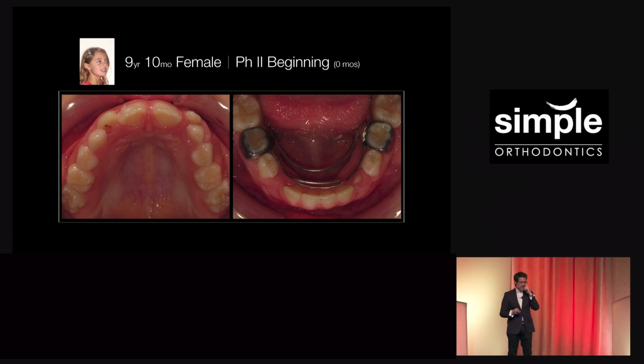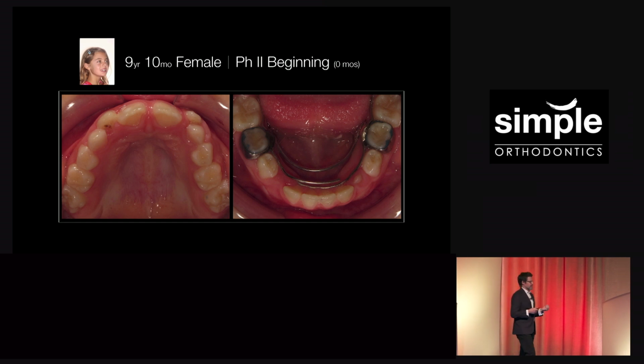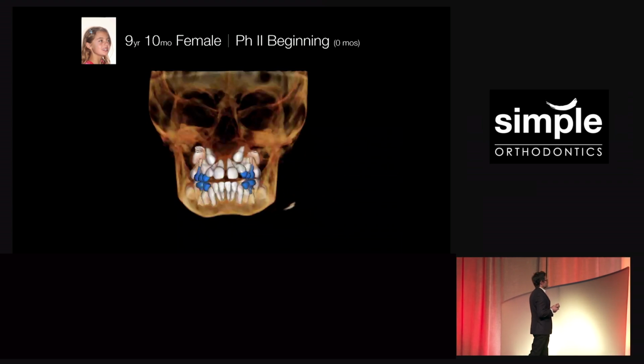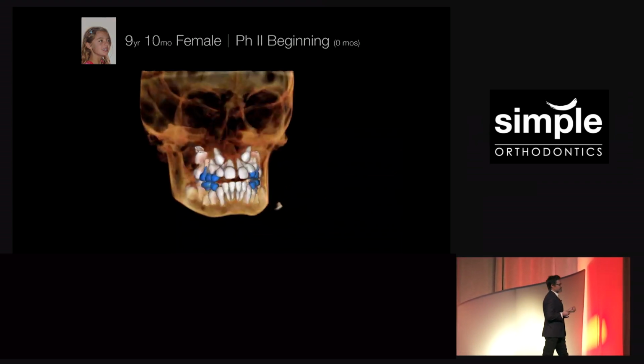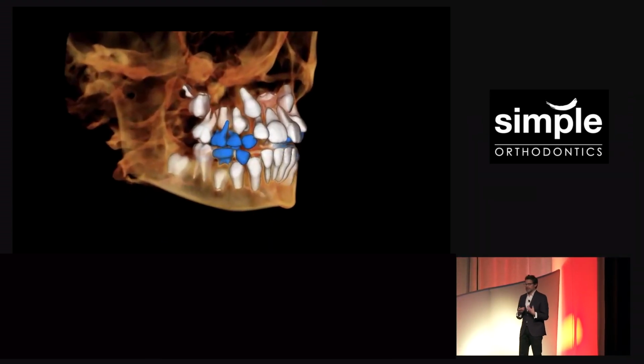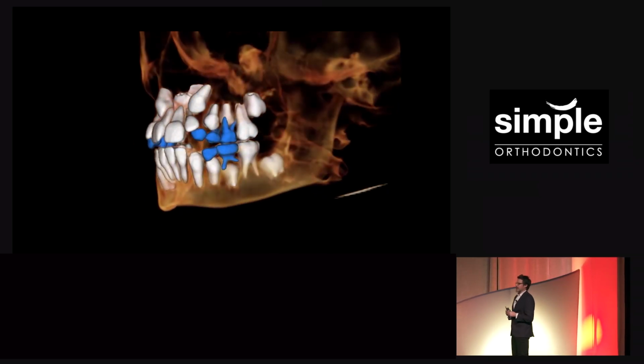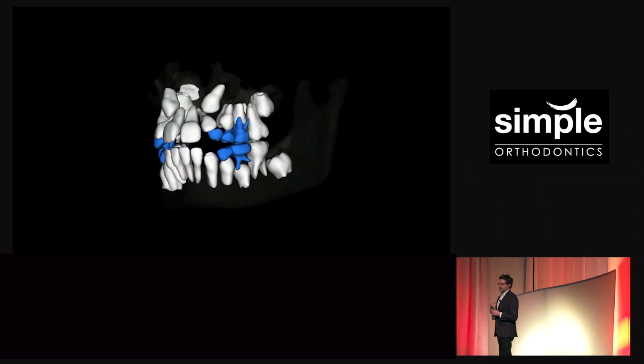So I ask you, what's the solution? How do we expand her to get these canines in place without making the dental problem worse? Here's what Angie looks like. I want you to go through your diagnostic list and figure out what you do in your practice with her.